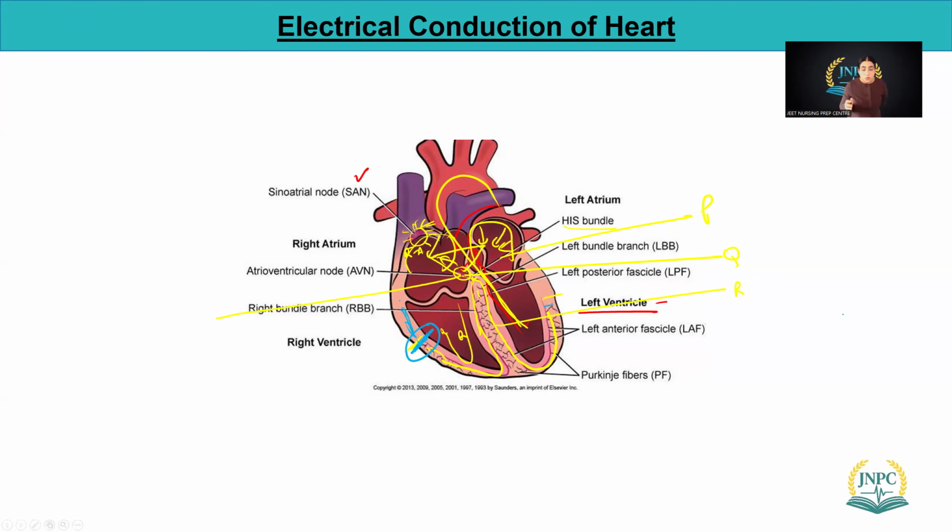And of course, this is a final touch, a final push that the ventricles have to do. So when your S is forming, that means the ventricles are at the maximum. Ventricles are maximally contracting at this point.